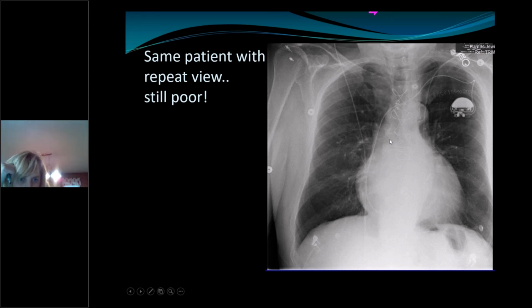Another one, which you probably won't care about and is almost no longer in use, is these things. A couple of people used to ask me if those were clips for a gown, and the answer is no. These are what they call anchors for rotator cuff repair, or as patients like to call it, the rotary cup. So this is from an old rotary cup surgery, which they don't even use anymore, those types of metallic anchors. Now most of them are bioabsorbable, and life is good. So just a few things to see on this particular image.